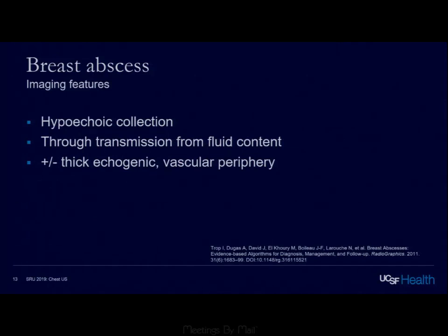So on imaging, the typical appearance is of a hypoechoic collection. If it has a lot of fluid within it, then it may be associated with through transmission. And unlike abscesses elsewhere in the body, they may not always have this thick rim. So if it does have it, then it tends to be a little bit echogenic and very vascular.